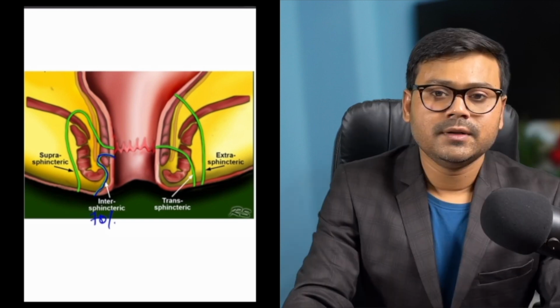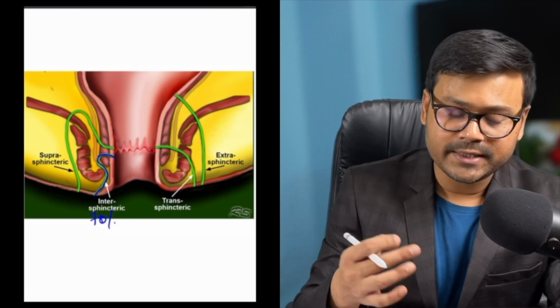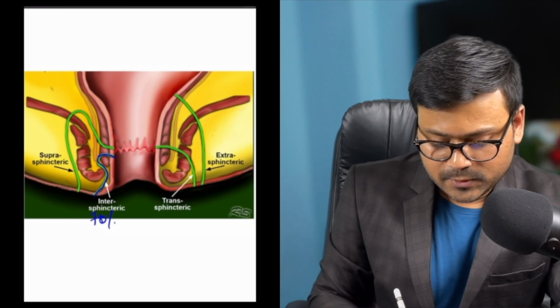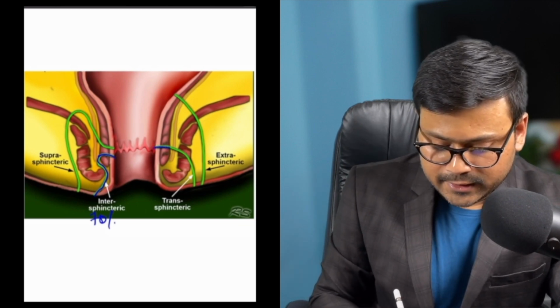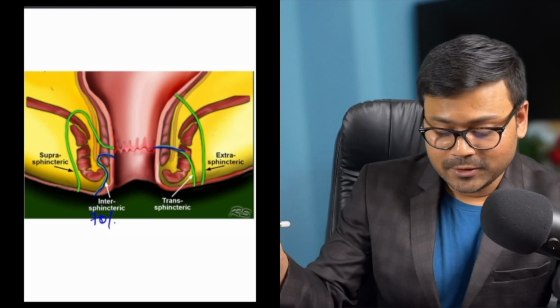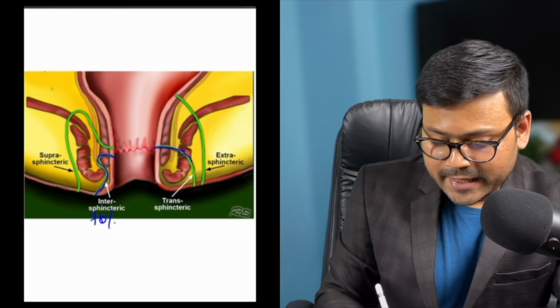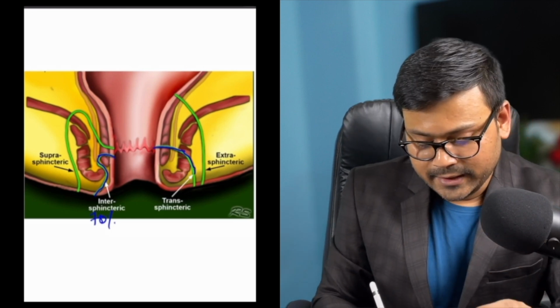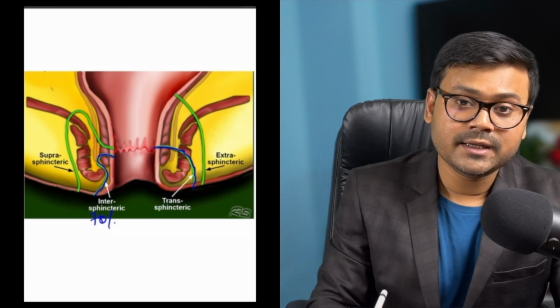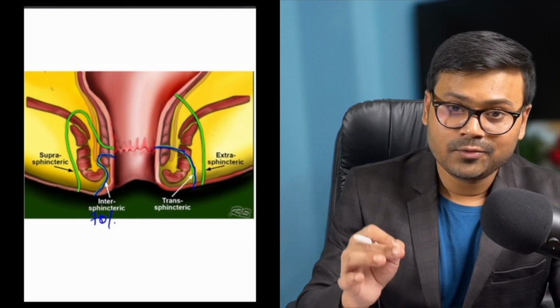See this? Now the second type of fistula, transsphincteric. In transsphincteric fistula, the fistulous tract starts from the anal canal again, crosses the internal anal sphincter, then crosses the intersphincteric space also, and pierces the external anal sphincter. It drains at the skin after traversing the ischiorectal fossa.